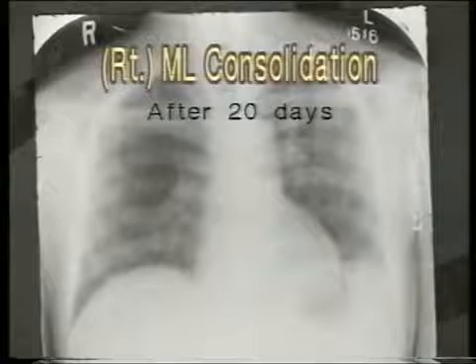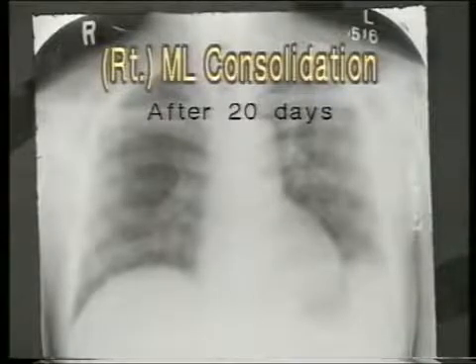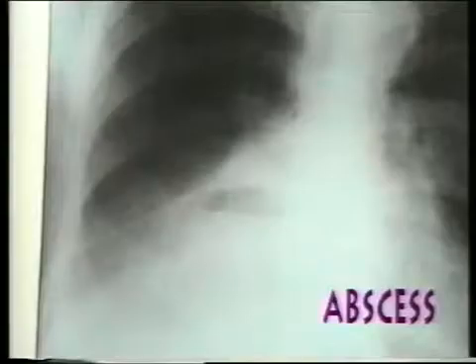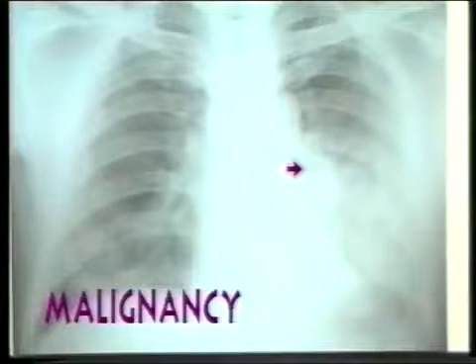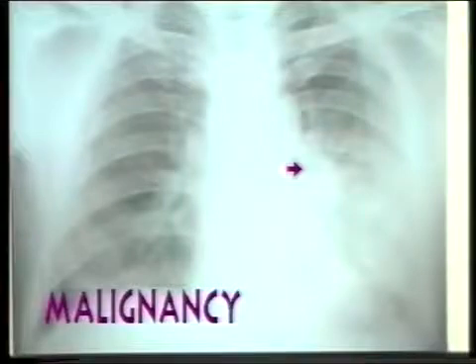This is to look for two important pathologies. Number 1, development of a lung abscess, empyema or effusion. Note this partially resolved consolidation showing an air fluid level typical of a lung abscess. And number 2, if resolution is partial, there may be an underlying bronchogenic carcinoma with partial obstruction of the proximal bronchus. Note this dense hilar opacity in this partially resolved left lower lobe consolidation.